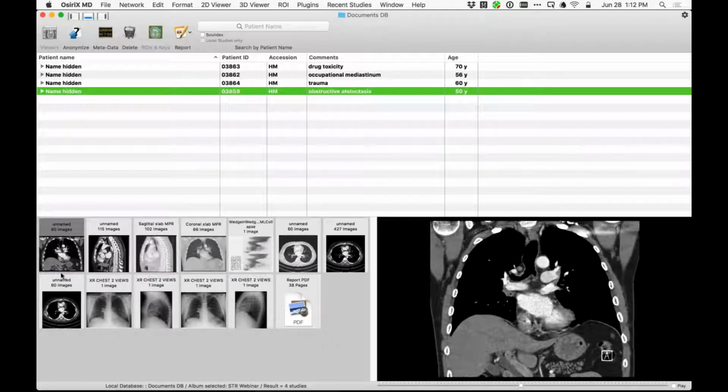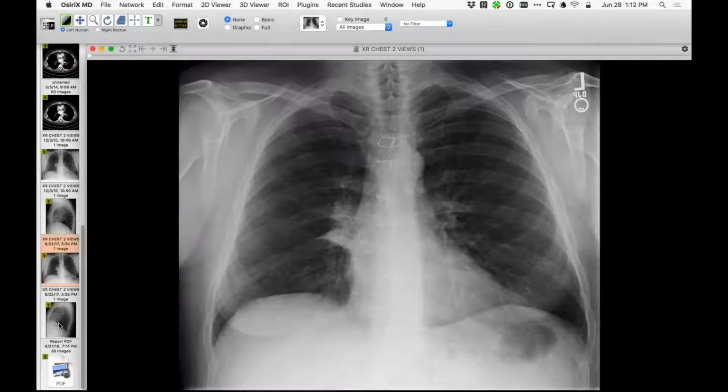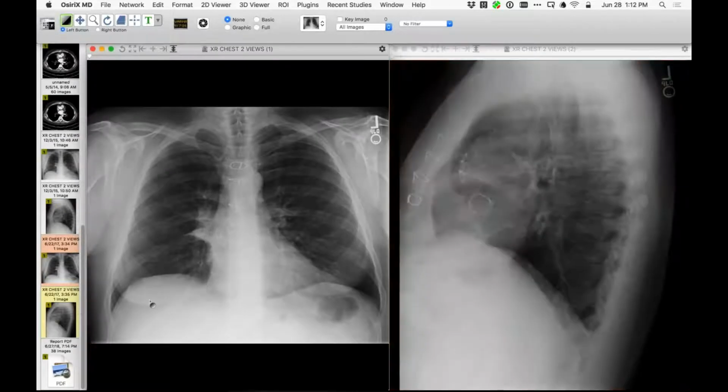This one's an anatomy lesson. Let me show you representative images of frontal and lateral. The finding that's interesting is not related to the cardiac surgery. We see a valve, CABG, but the finding that's really interesting is related to this right here.